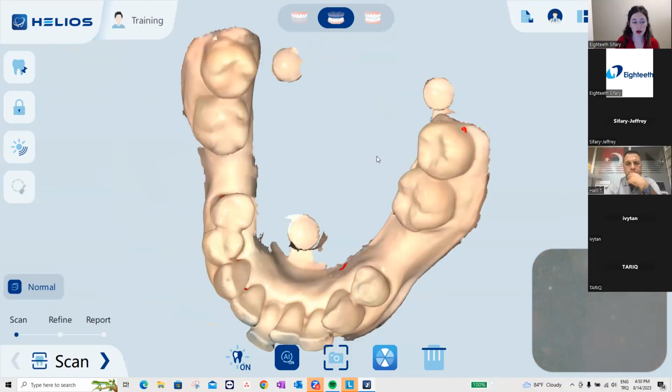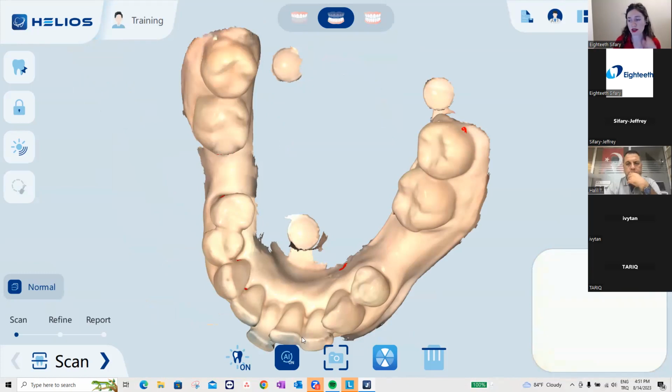And also it's mostly common questions. There is an AI feature, artificial intelligence. It basically removes automatically soft tissues, which we don't need. How can I turn off and turn on this feature tool? There is a button in the lower, AI on. Now, as you see, it was on mode. If I turn to the off mode, it will not be erasing this area. I'm going to talk about later when we need to turn off and on, but mostly please keep it turned on, okay?